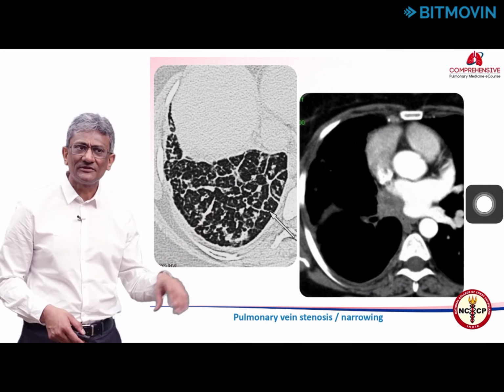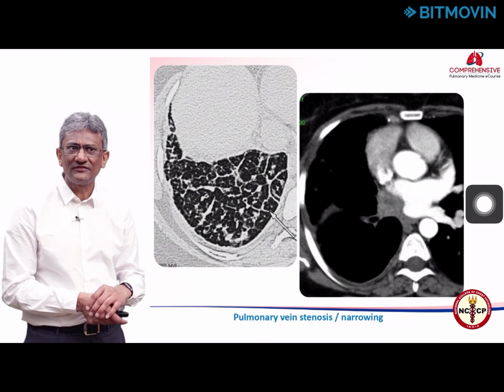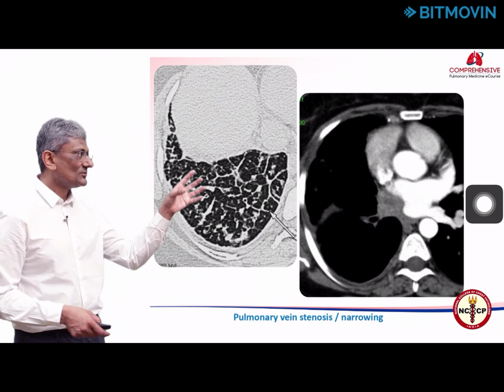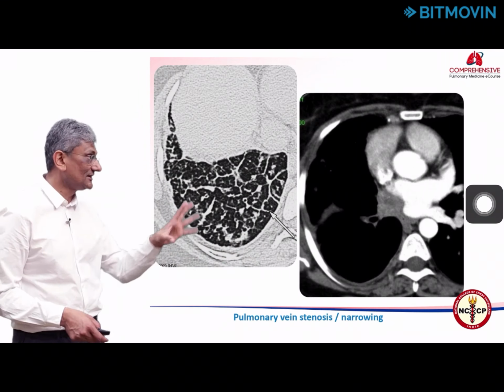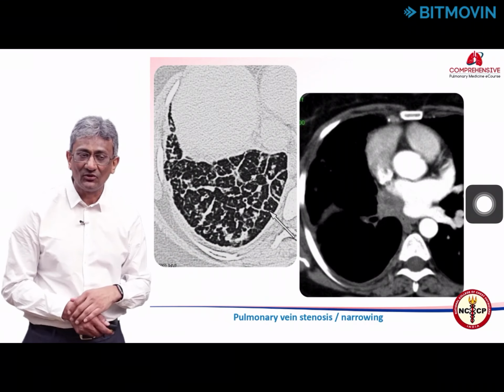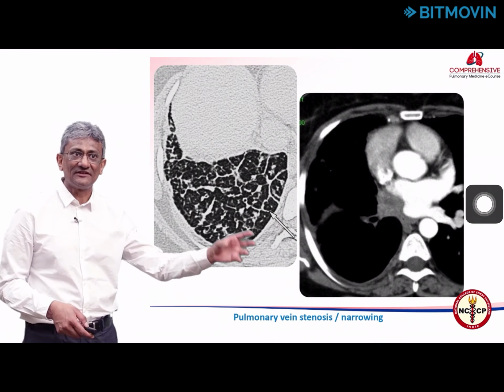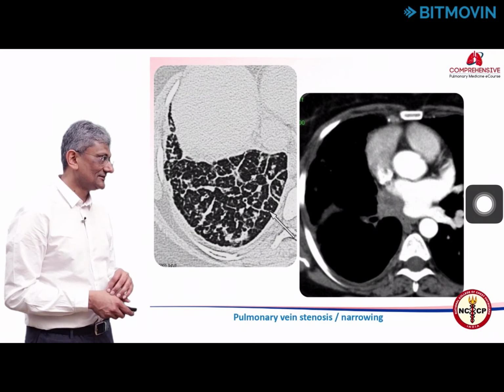This is a patient with mediastinal fibrosis. On the right we see a mass that is occluding the right inferior pulmonary vein, and because of the venous occlusion we have venous congestion in the right lower lobe where we see septal thickening outlined by the white arrow, and this is another cause of segmental or lobar septal thickening when there is a pathology of the draining vein.